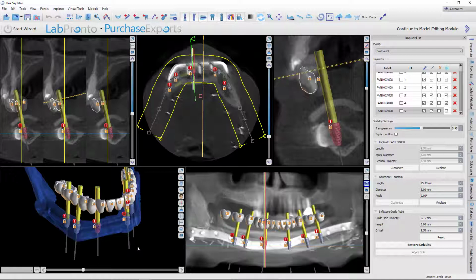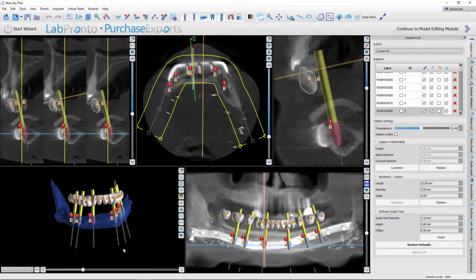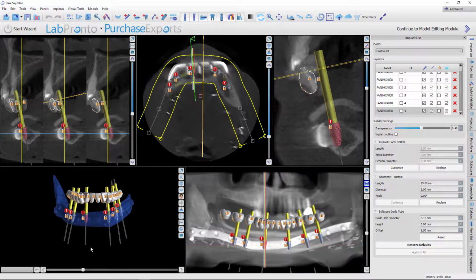On a mandible, typically it's not as critical because you set the mandible based on the maxillary teeth. It's setting the maxillary teeth normally that I find this so valuable, because again, translating my ideal of what I've accomplished in 2D based on facial aesthetics, setting that maxillary arch at the right position is the critical step.